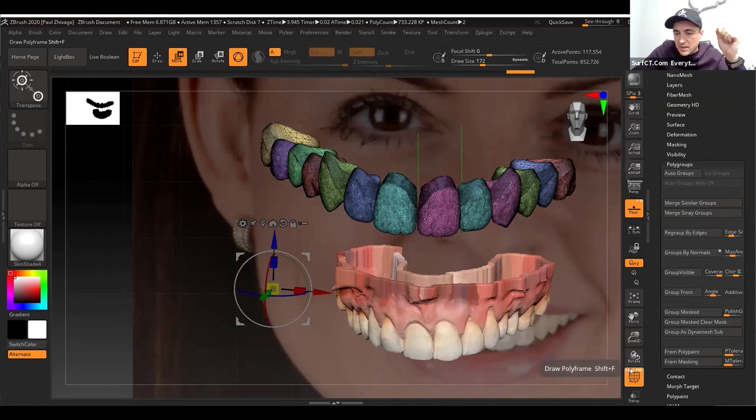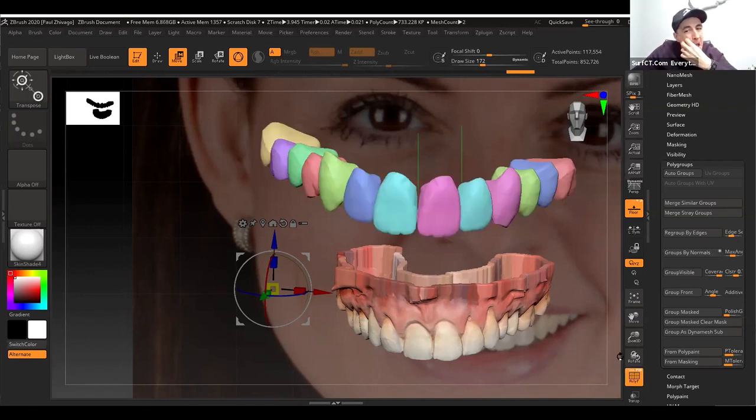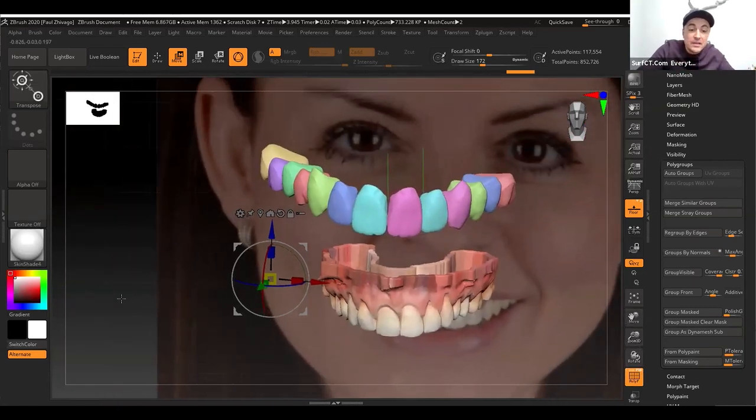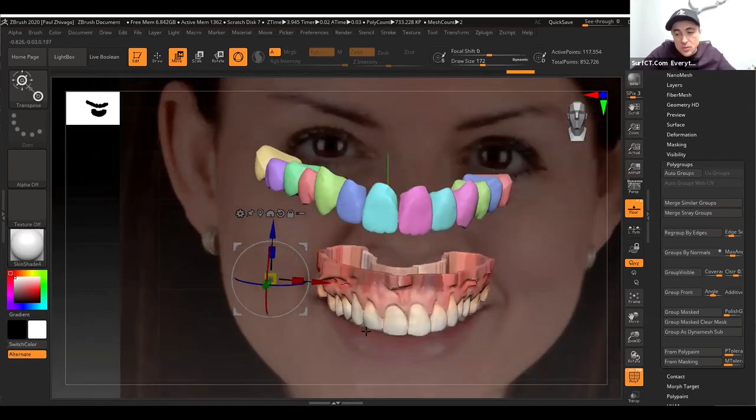And you can take the lines off as well. This is just to click on here, but leave the fill in that you see the different groups. And now you can see that there are different groups based on the colors of the teeth. And what happens is, since you're in move mode and in scale and rotate mode, you can't really draw on these things. So you can only move things.